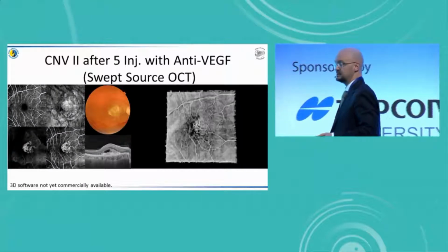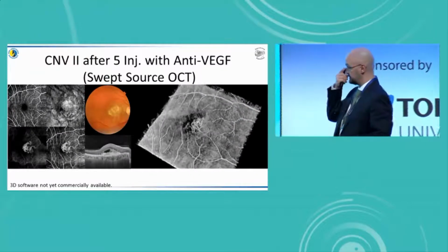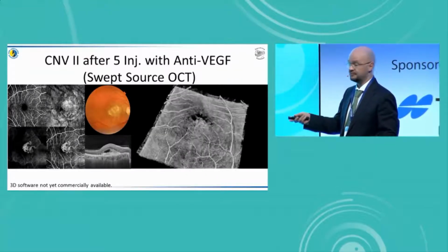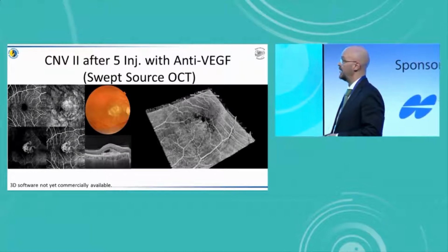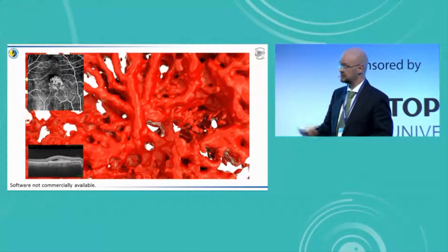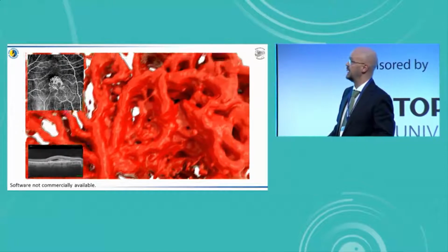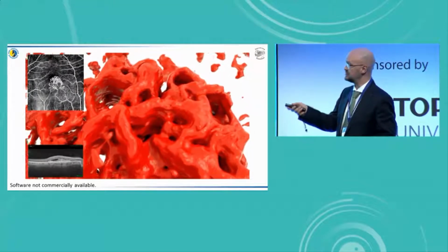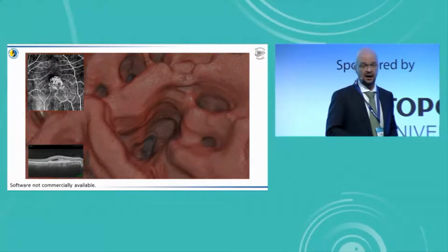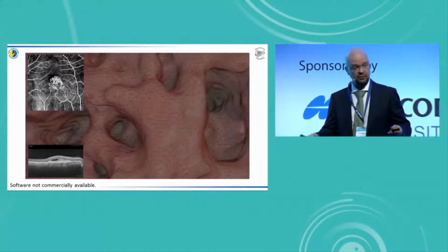So you obviously saw before that a lot of my research is involved in creating three-dimensional reconstructions of swept source OCT data. And I also, of course, create three-dimensional reconstructions similar to the ones that Peter was making. Because I think that we can use these kind of reconstructions to do volumetric analysis of the lesions and see how they grow and how they shrink.